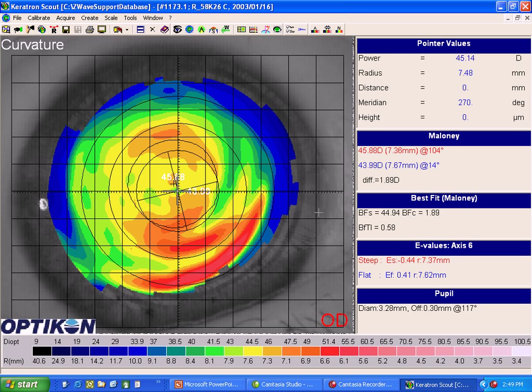In this case, we see distortion and we see asymmetry, but with experience you will learn that what this is, is an imprint from a contact lens. This arcuate quality to this inferior steep area is quite unnatural appearing and too smooth and regular. This patient has been wearing a gas permeable lens that was apparently riding high. Now that's a good tip-off. You may have the same experience when you design a lens for this same cornea. The upper lid may be tight or something and causing the lens to ride high.